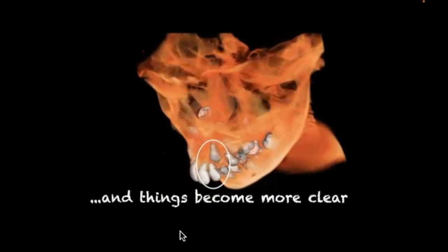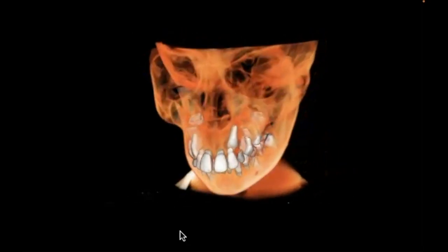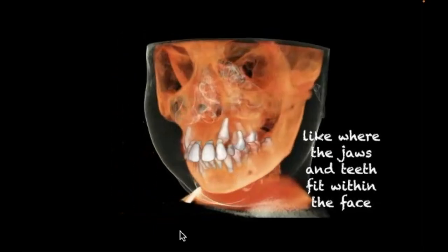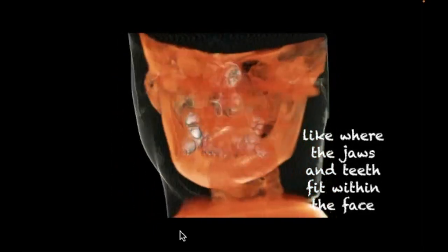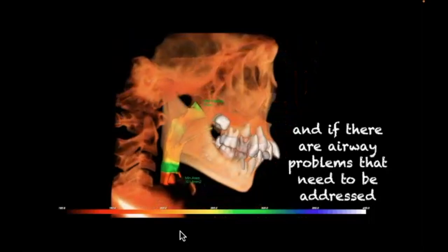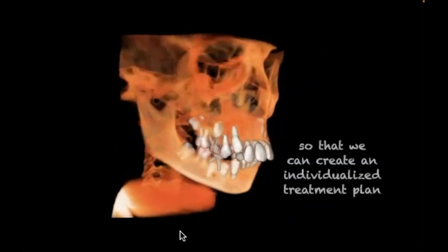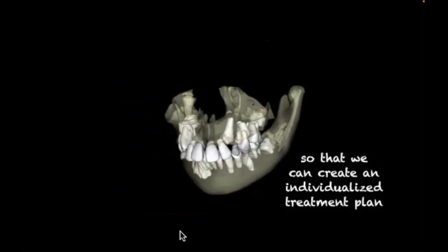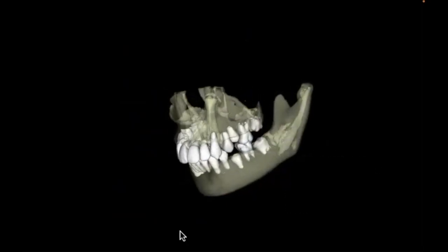A lot easier to see what's going on. This is called Anatomage. They create STL files of each of the teeth and the jaws sectioned from a cone beam, which allows you to actually treatment plan and move those teeth. So you can actually project proclination, crowding, treatment plans, whatever you want. You can see within their jaws what that's going to look like, and how much bone they're going to have. In this case, we treatment planned expansion, consolidation of space.